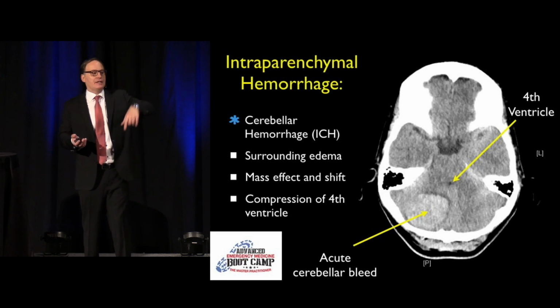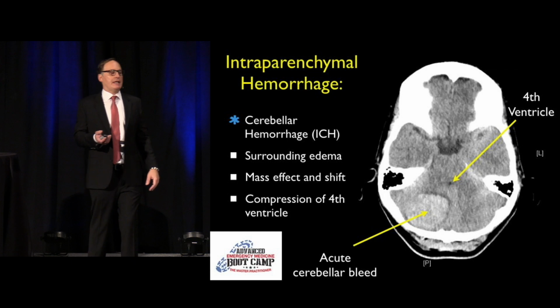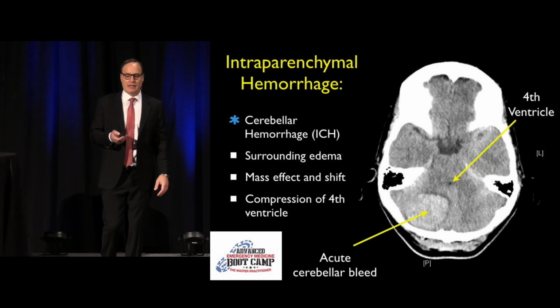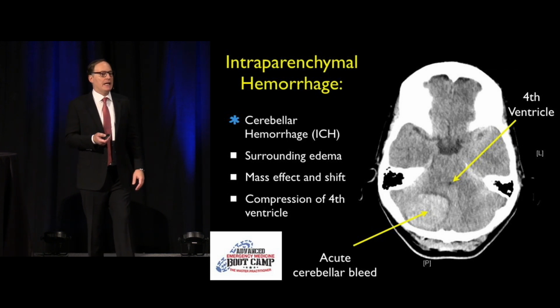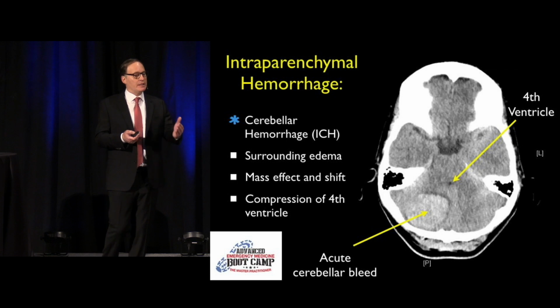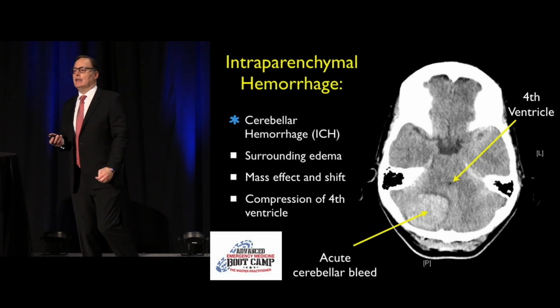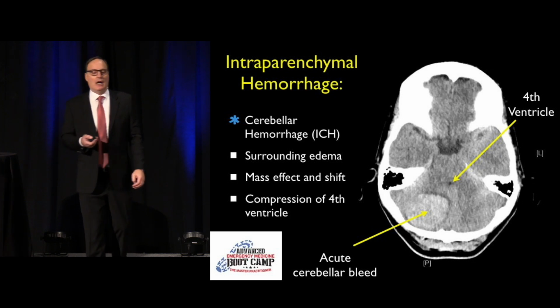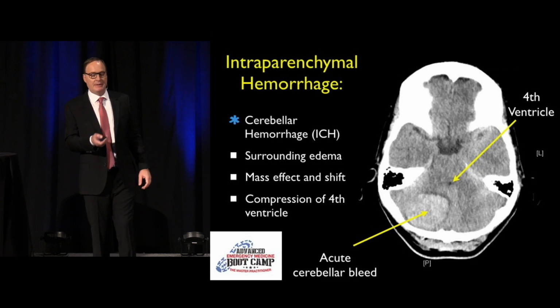And you know, neurologists love it when they see vertical nystagmus, because that is usually central. Okay, so central in cause. We got a CAT scan, and we can see that there is actually a bleed within the cerebellum. This turned out to be an AVM. The patient was quickly diagnosed, operated on, and actually did very, very well, so had a very good outcome. Okay, so this is one of the times where you can see pathology within the cerebellum, but sometimes it can be difficult.